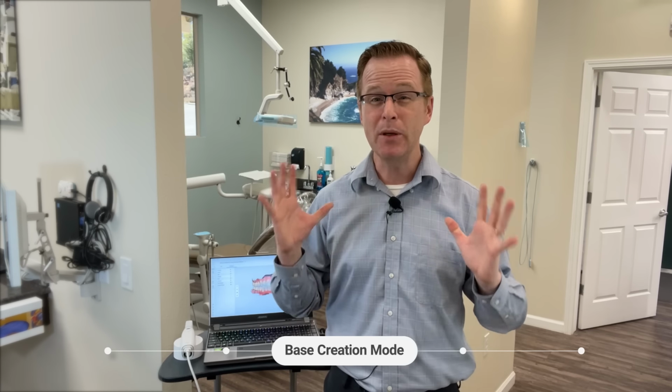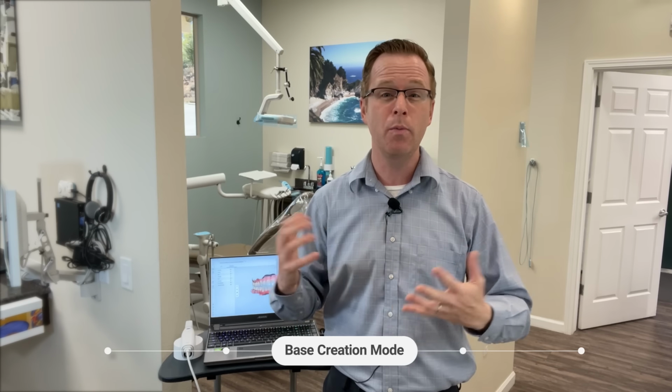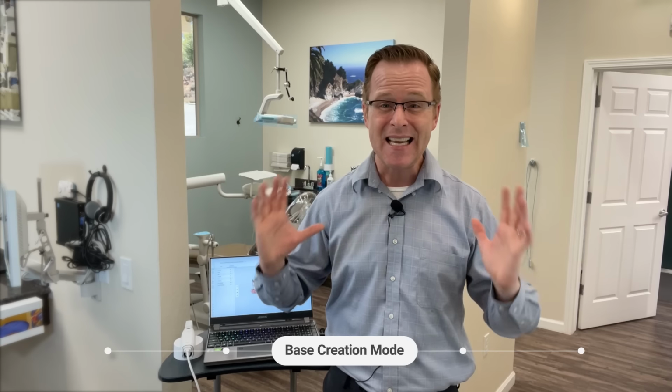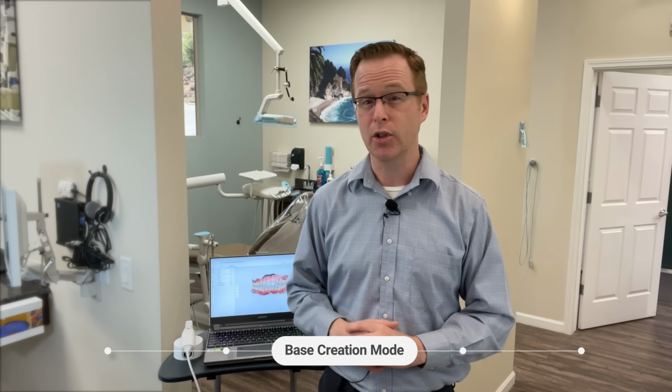Additionally, the software has built-in hollowing functions for the model. So we can choose if we're going to do a 2mm or 2.5mm or whatever hollow function you want built into the models. The Medit software and the model builder function within Medit allows it to instantly create a hollow, simple-to-create model, all built in within the model builder function.